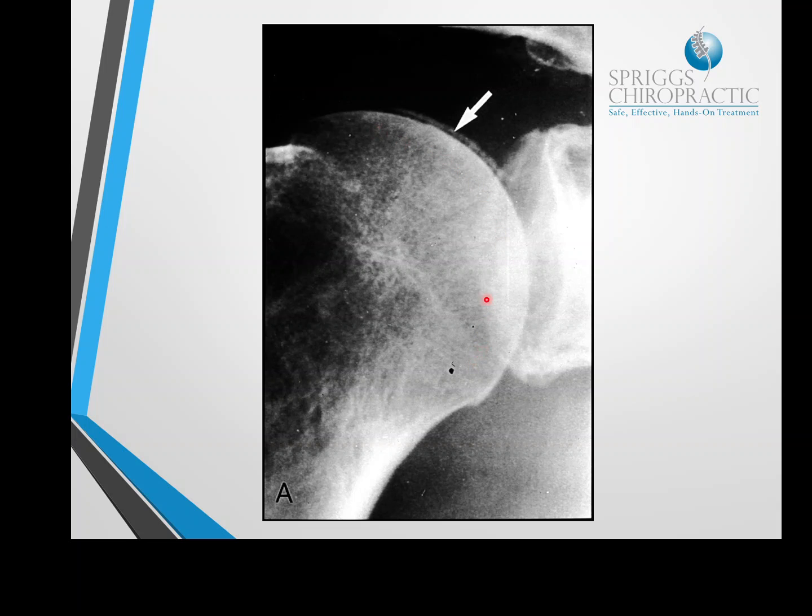So in this particular case, there's not much in the way of erosion. There's no subchondral sclerosis. Argue a little bit, it's got subchondral sclerosis just there, but it's quite subtle, especially with an image with this higher level of contrast as well. There's no subchondral cysts. There's no real obvious loss of joint space. So again, it could easily be missed.